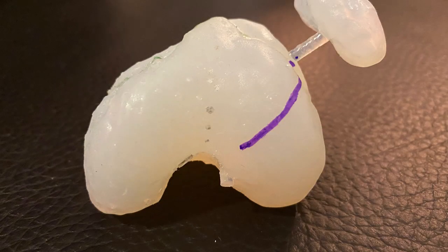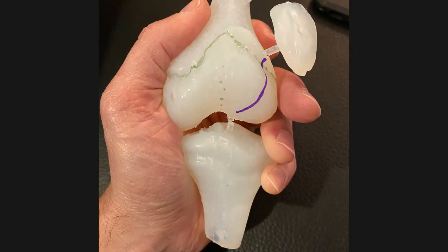By looking at the distal femur end on, you can see that the path of the patella is nowhere near the trochlea. This helps me greatly to understand the complexity of this anatomy and to try to figure out exactly how I'm going to reconstruct this knee. The dysplasia seen in this case is the result of a complicated interaction of muscle forces that are irregular and difficult to quantify. But by holding the anatomy in my hands and looking at it from different angles, I can begin to understand what led to this, and maybe things that I can do to reconstruct this knee so that there's a lasting impact on this young girl's life.